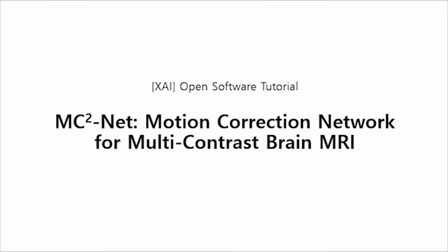Hello, this is an XAI open software tutorial. We propose a motion correction network for multi-contrast brain MRI method called MC-squared network.